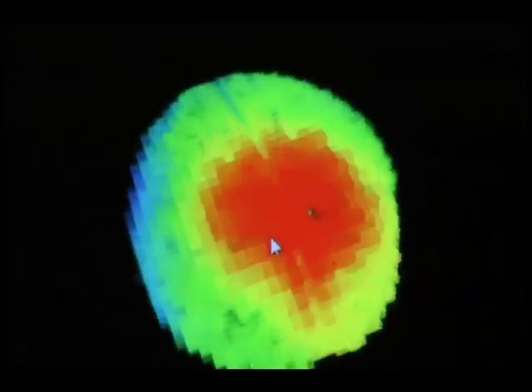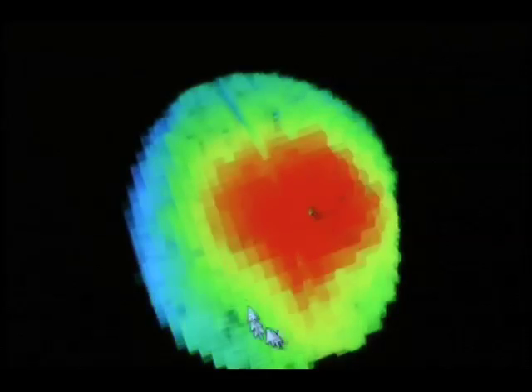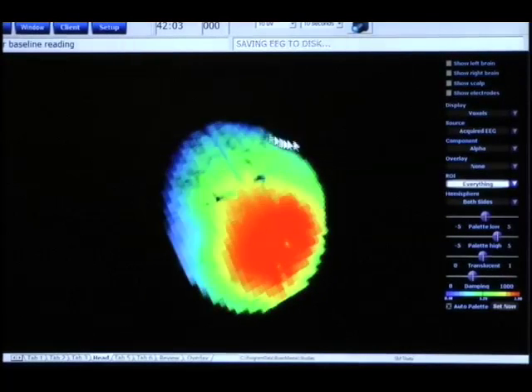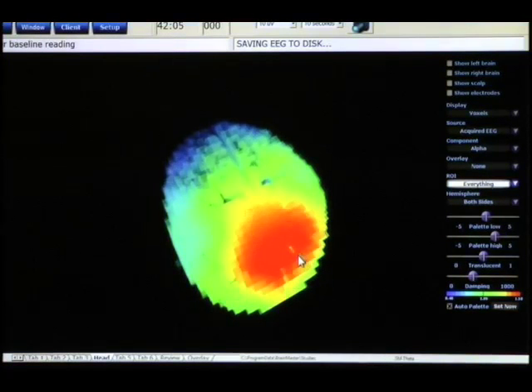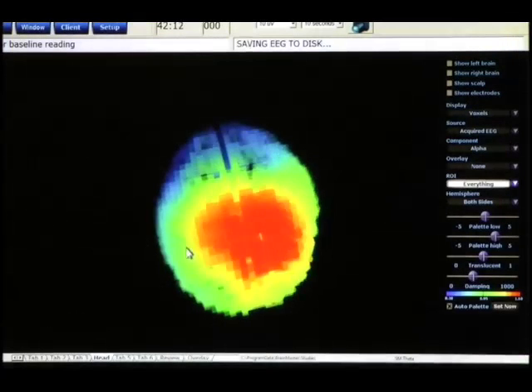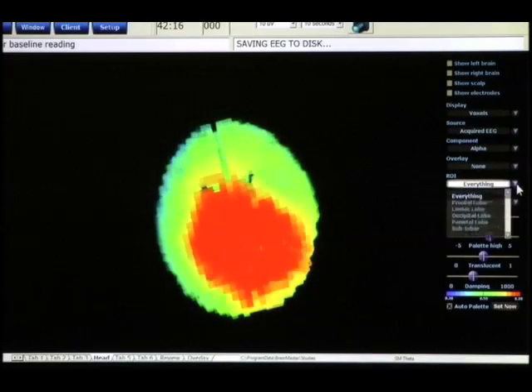The next important capability that we're going to review is the ability to choose regions of interest, what are called ROIs. In this display right now, we're looking at the entire brain, and we're seeing that the regions where there's activation are going to be colored basically orange or red, and the areas that are not active are blue or dark. And right now we're looking at everything. And we have choices then.